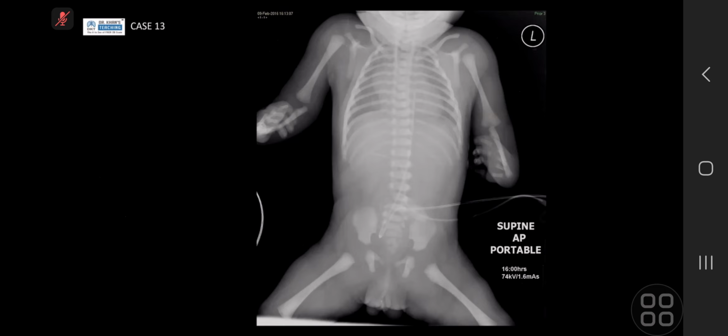Okay. So once you've made the diagnosis of esophageal atresia or tracheoesophageal fistula, there are other things that you're assessing for to make another diagnosis. What other things do you think you may be assessing the radiograph for? I think I'm going with a syndrome. I think it's VACTERL. Okay. So what things can you assess as part of VACTERL on this radiograph?